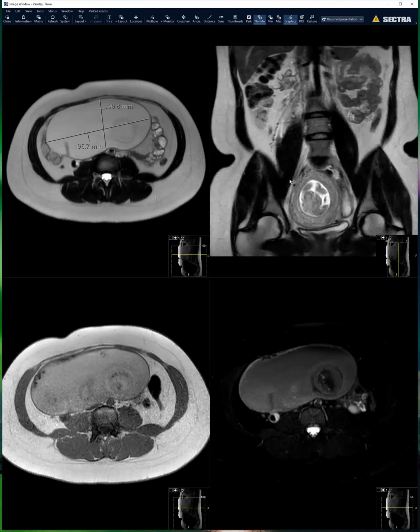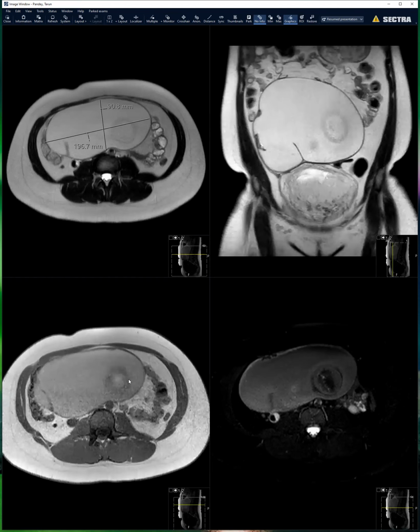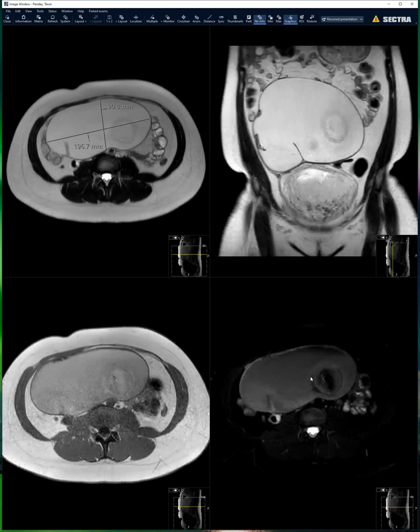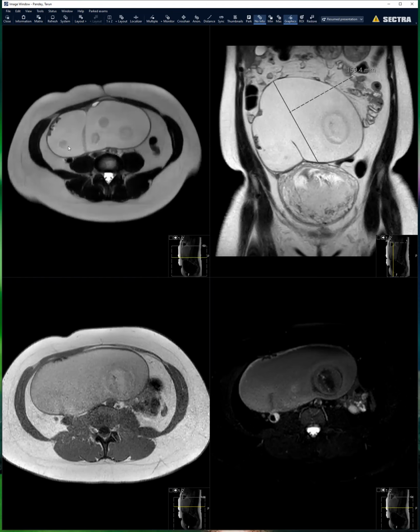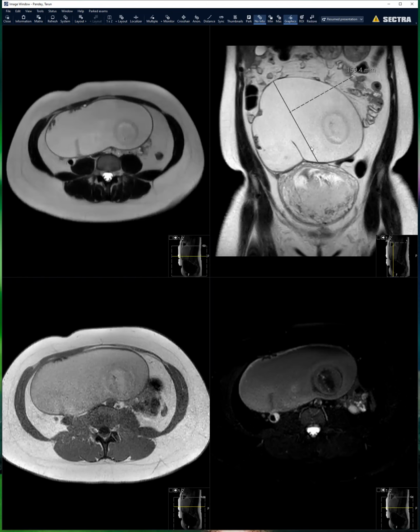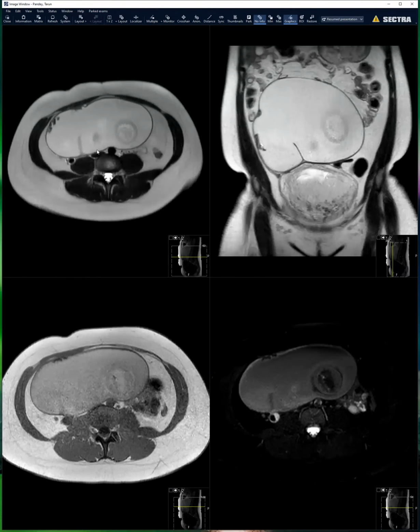I'm just scrolling through. Huge dermoid. Is it satting out? No. Yes, actually, yes, that's right. What we were really not sure about is what this whole structure is, because it is like a tube. Yes, exactly. It looks like a tube. So what are these small things which are within this tube?